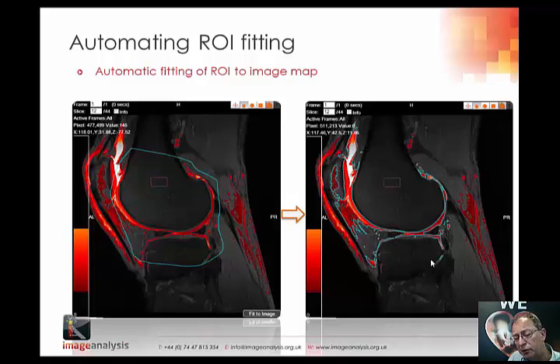So I now have quite a lot of ROIs. Within the functionality, I can choose the minimum size of a ROI that the software will shrink the big ROI onto. So I can remove these simply by setting that threshold to be about 20 pixels or something like that. And where I've got things which I still don't want, I can just delete those from the ROI table. So very, very quickly, I go from having a very complicated, intricate cartilage shape to it being segmented.